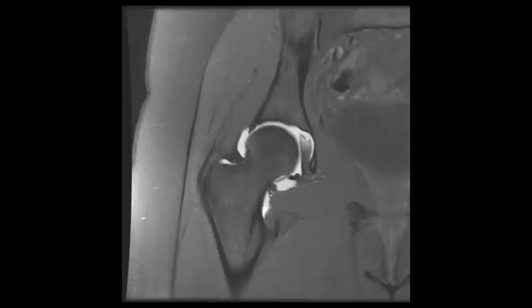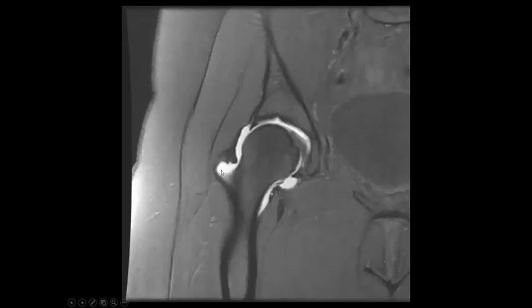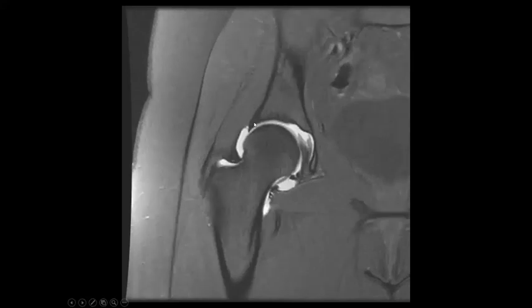And this is how it looks. So if we scroll through the hip joint using the arthrographic technique, there is gadolinium in the hip joint, and we see the labrum, which is this triangular structure, hypointense signal on the coronal T1 fat saturated sequence, and we can assess it quite clearly here because of the optimization of the contrast between the fluid, which is the gadolinium, and the labrum itself.